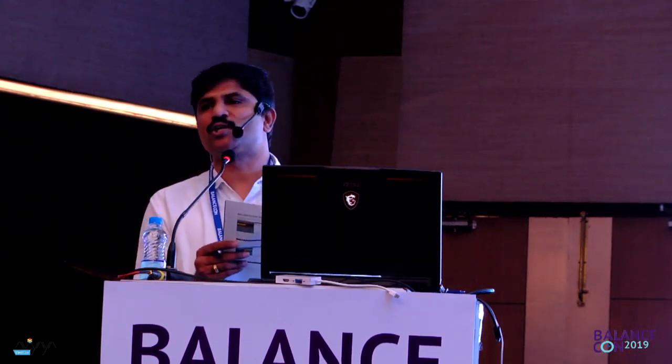You can see the gain written there. For the first one, the gain is somewhere around 0.79 and 0.81 in both eyes. That is a very robust right beating nystagmus. Whereas for the left beating nystagmus, the gain is coming to 0.43. So you see a significant gain asymmetry, which again is a feature that says there is an underlying vestibular tonal asymmetry. Shall we proceed to the next item?